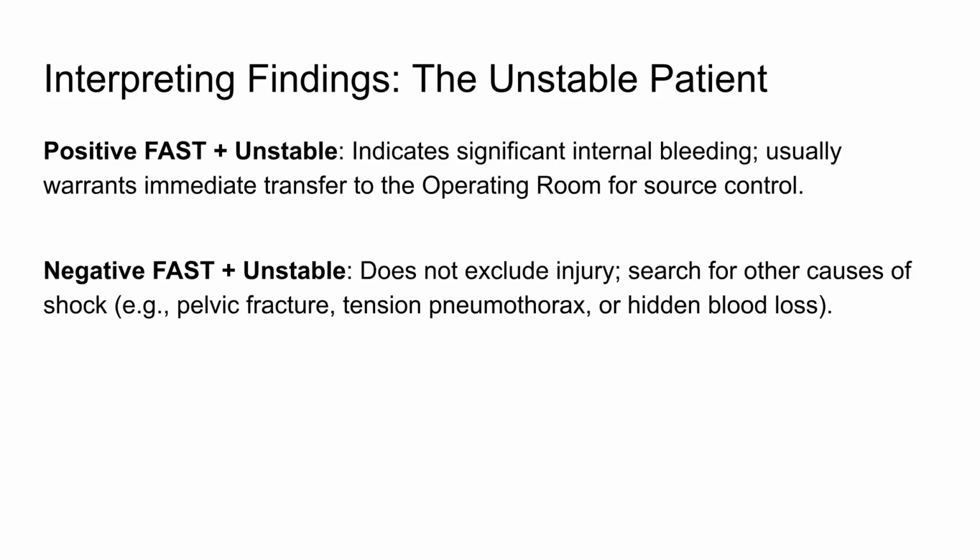Interpreting FAST for the unstable patient. A positive FAST indicates significant internal bleeding, often requiring immediate transfer to the operating room. A negative FAST does not exclude injury. Search for other causes of shock.